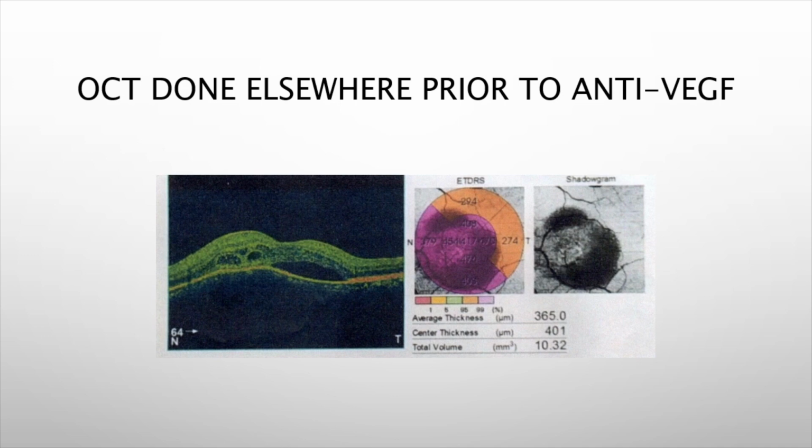And you can have a CNVM also, but in this patient, of course, CNVM was not there, because it is a heavily pigmented lesion. So on an OCTA it will be difficult to see, and on an angiogram also. So this patient did not have a CNVM. If you have a CNVM, you can have fluid again, or a nevus itself can also produce an SRF. And if the patient is symptomatic, then we are justified in treating the patient with anti-VEGF. That is why we put that other study also. What are the associations wherein you could have an SRF?